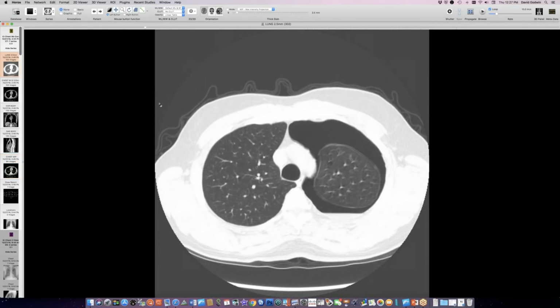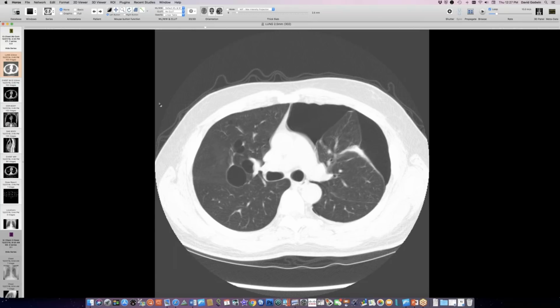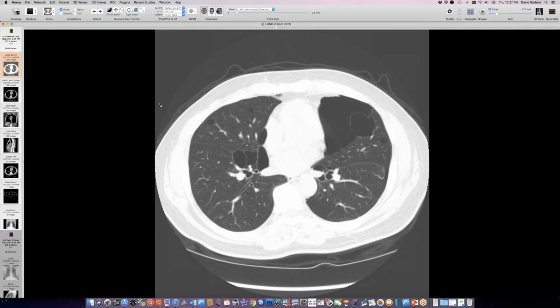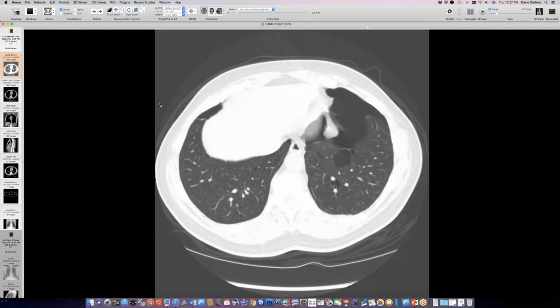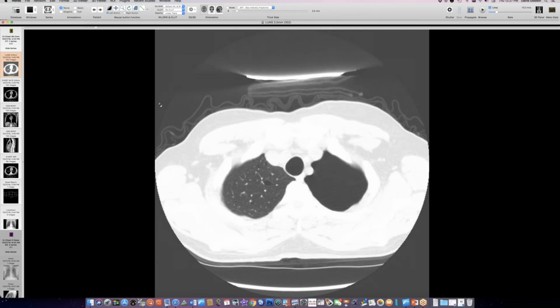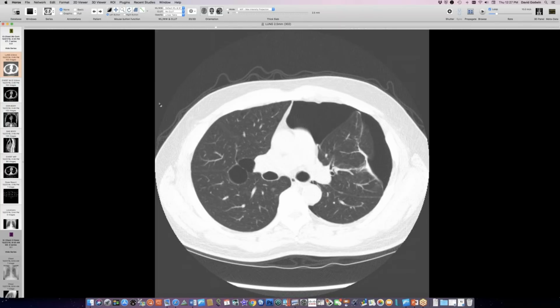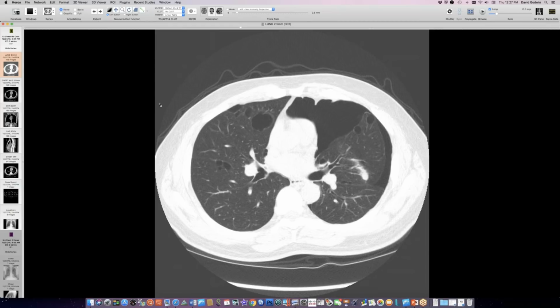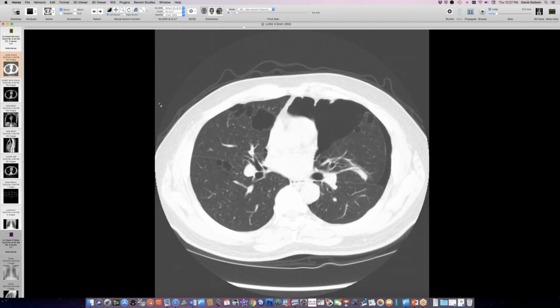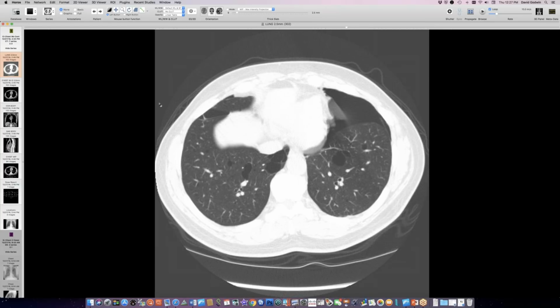Yeah, here we go. So we got a chest CT, talked to the surgeons who were going to do pleurodesis on him. I just wanted to get the rest of the lungs to see the distribution of cysts, and they are basal predominant, sort of mid-lung and basal predominant. He'd not had any previous pneumothoraces before this one popped up in December. And it was drained for a while, it was stabilized, and then it recurred, and then he was sent to the U. He did get pleurodesis. So now we've alerted them to the probability that this man has Birt-Hogg-Dubé.